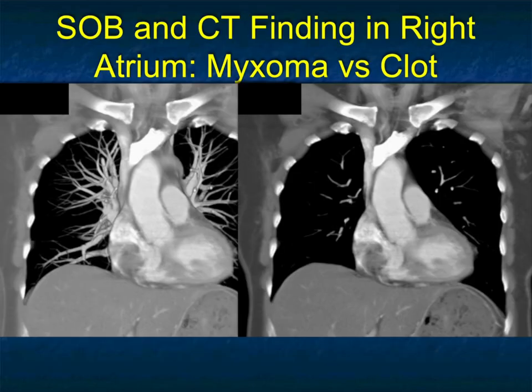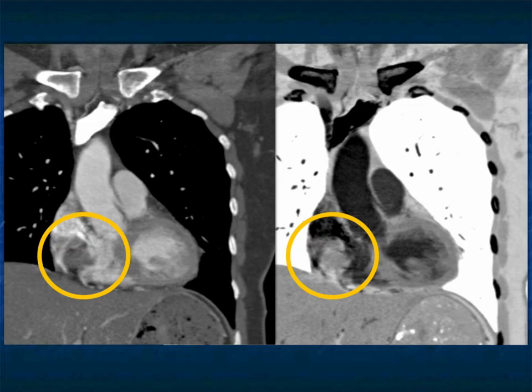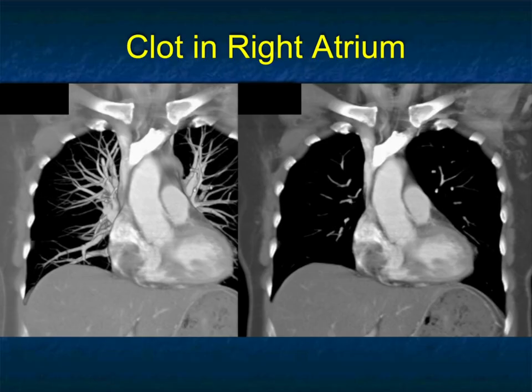you. What about this case? Is this another myxoma, but in the patient's right atrium? Well, there's a mass. It's 2 centimeters. It's somewhat lobulated. It's not enhancing. It's shown nicely on the black blood technique images. Well, what is this? Well, this patient does not have a catheter present now, but had a catheter previously for several weeks, and this ended up being a thrombus.